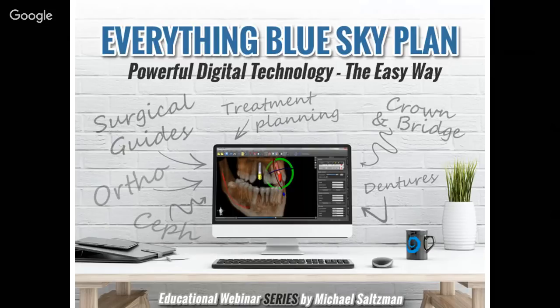The point of this webinar series is to show, demonstrate, and teach practically how to use the Blue Sky Plan software. We're going to focus on a lot of the process flows that were demonstrated and mentioned in previous, more clinical webinar presentations. The goal of this webinar series is to show the techniques so that you could use them in your practice to benefit your practice, yourselves, and of course, your patients.